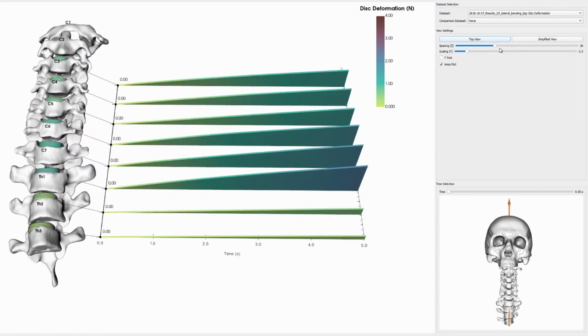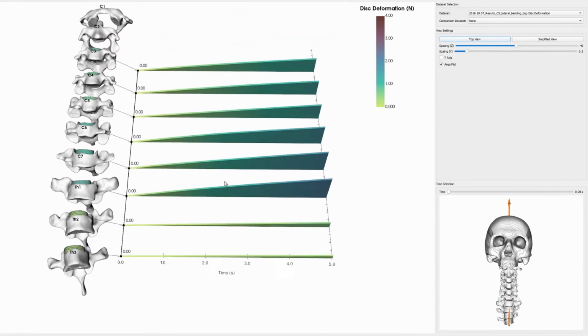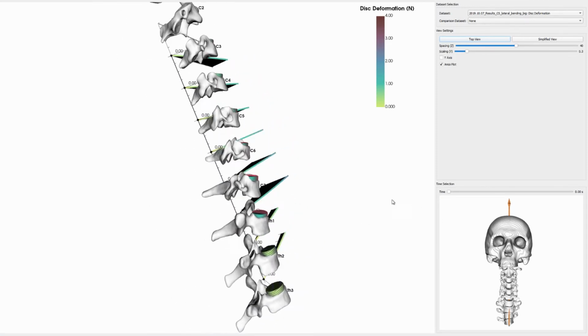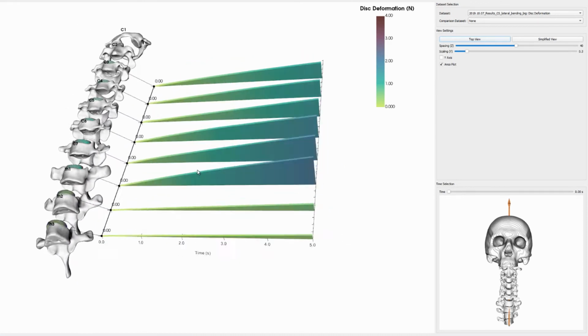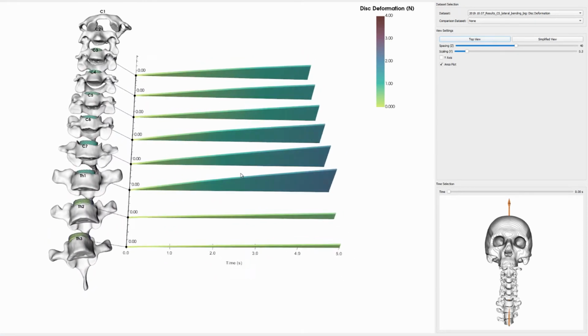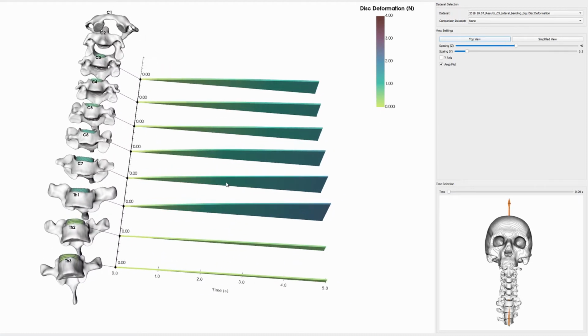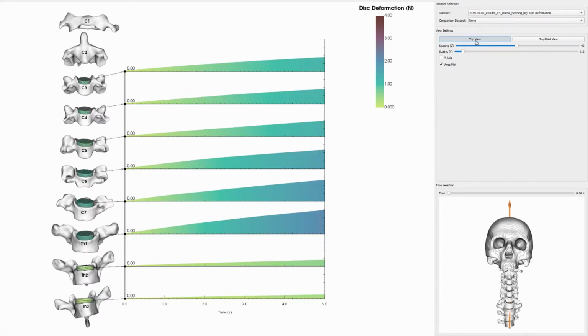In this 3D scene, all plots remain in anatomically correct positions regardless of the spine model orientation. However, perspective distortion may lead to some unwanted effects, and sometimes it is better to not have a scene interaction or to not have it necessary. For this reason, the expert can switch to a 2D representation. Here we show the plots in a juxtaposition and align them on a shared time axis.